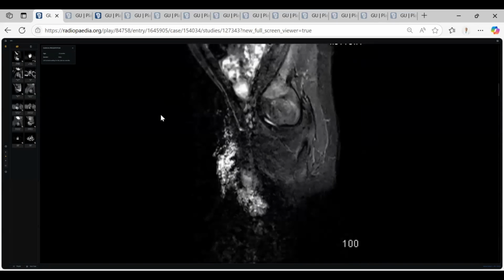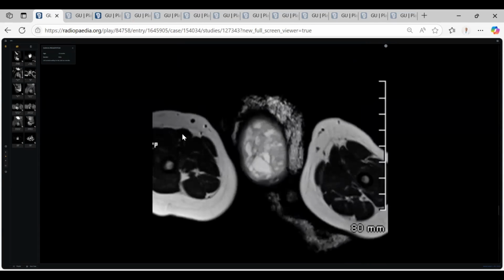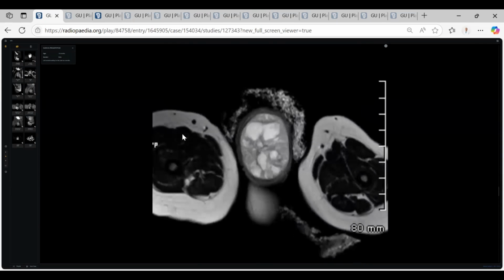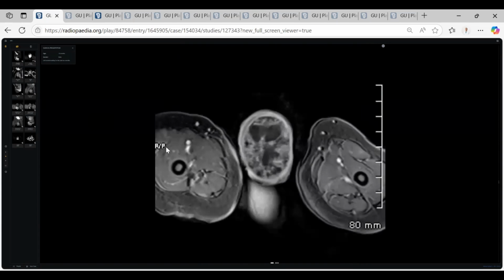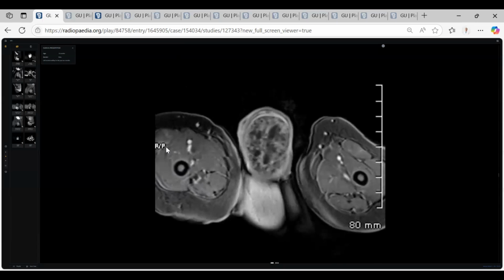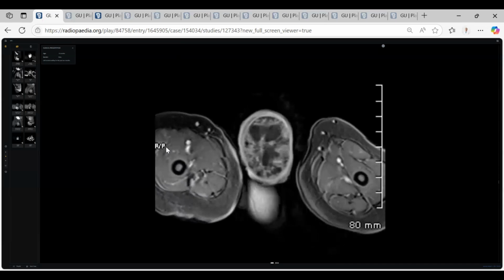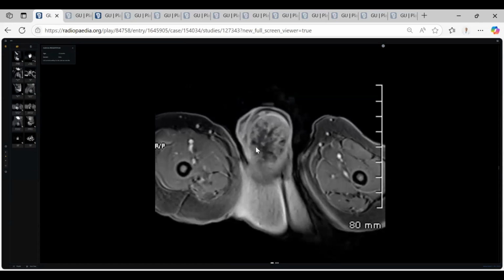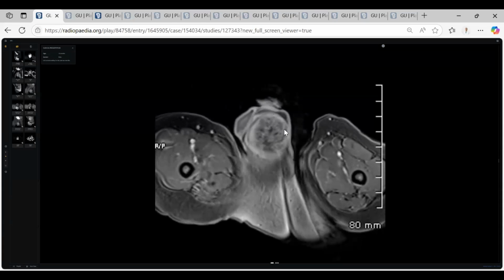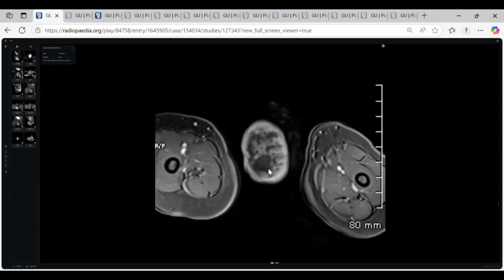I have been provided with sagittal MRI images of the pelvic region. These are T2 images. Here I can see there is a heterogeneous mass lesion noted within the right testicle. It is heterogeneous with internal hyperintense areas and some solid component. The solid component shows enhancement. Some solid component or mainly solid with central necrosis? Yes, there is central necrosis and some solid component at the periphery, which shows significant enhancement. This is an almost solid mass, and there are central moderate cystic changes. The mass is almost solid, with central moderate necrosis. Okay, go on. What's your differential diagnosis, doctor?